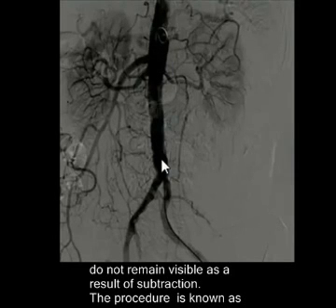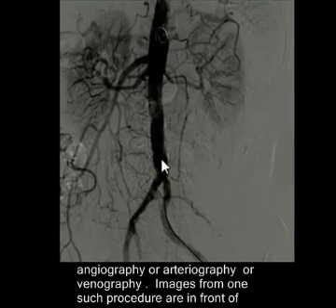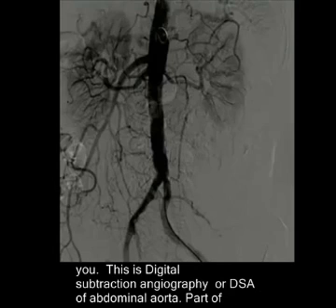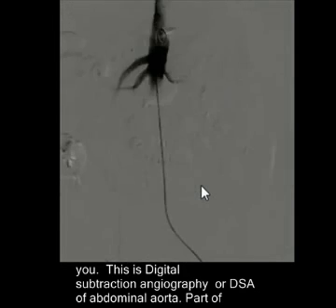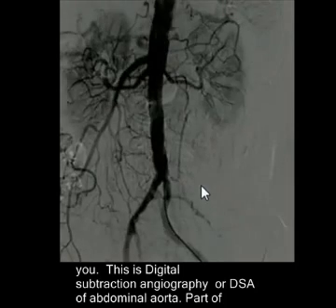The procedure is known as angiography or arteriography, and if you are aiming to visualize the veins, it is known as venography. Images from one such procedure are in front of you. This is digital subtraction angiography of the abdominal aorta.